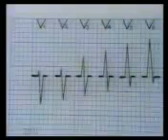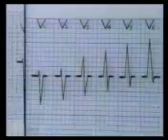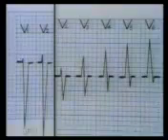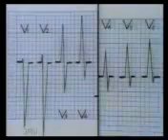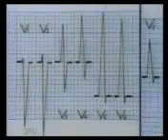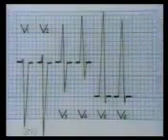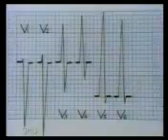In left ventricular enlargement, this pattern remains the same, but the amplitude of the waves increases. This is the normal pattern. Now in left ventricular hypertrophy, note that there are deep S waves in V1 and V2. R and S waves are equal in V3, and there are very tall R waves seen in V5 and V6. That is, in left ventricular enlargement, there is normal progression from negative deflection in lead V1 to positive deflection in lead V6, but the amplitude of the waves increases.